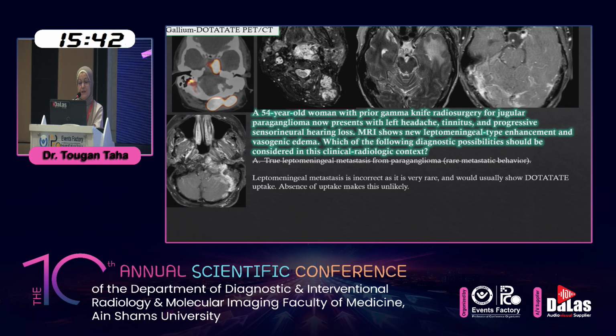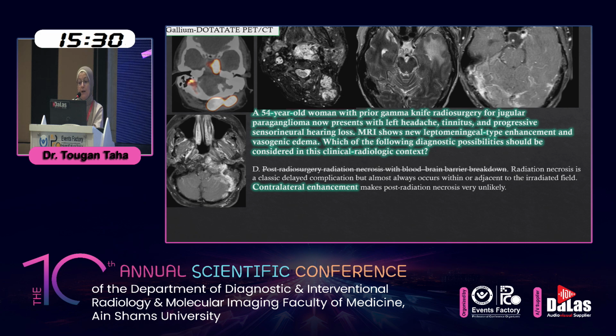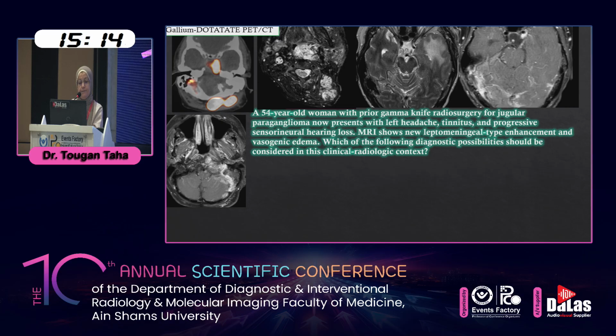Leptomeningeal metastasis is incorrect as it is very rare and it would show dotatate uptake. The absence of the uptake makes this unlikely. Radiation necrosis is a classic delayed complication, but almost always occurs within or adjacent to the irradiated field. The contralateral enhancement makes post-irradiation necrosis very unlikely.